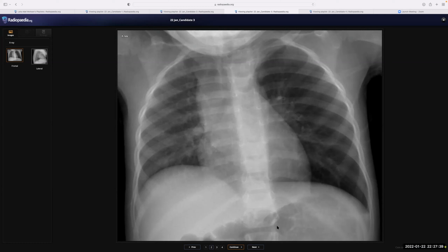As there is no pleural effusion and the vasculature looks smaller than the other side, this gives me the impression. I will also look at the hila, whether small or big. The left hilum is smaller than the right. All these give me the impression of Macleod or Swyer-James syndrome.